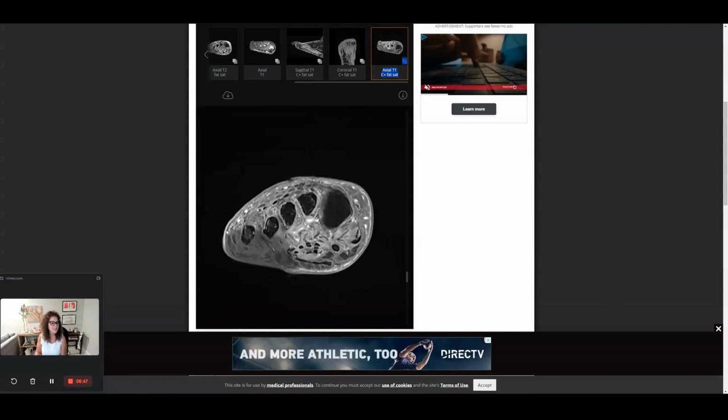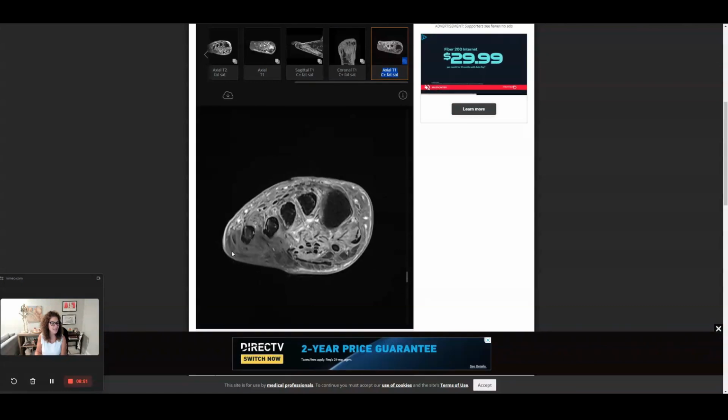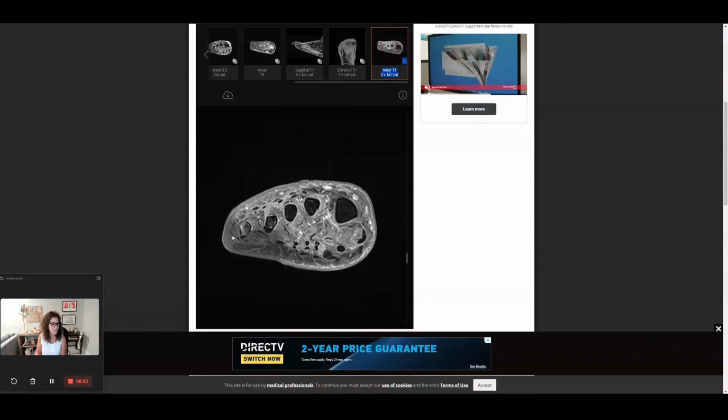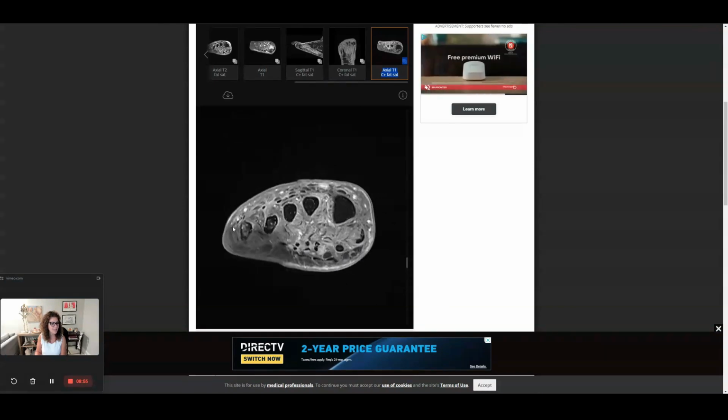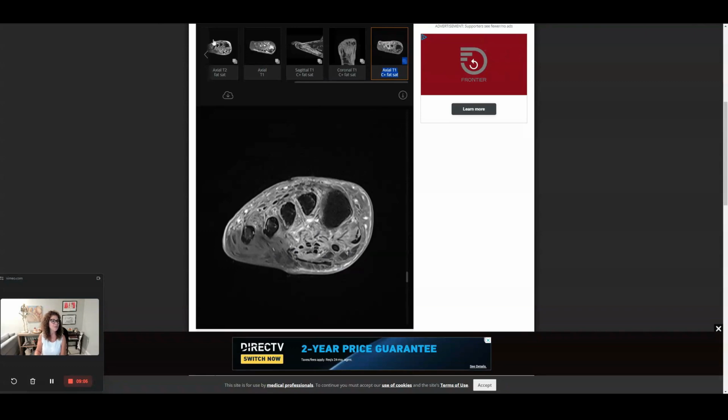Notice that the cellulitis of the positive enhancement in this location and necrotic tissue in this location lower down, and that dividing line between the enhancing pattern of cellulitis and inflammation with cellulitis and the non-enhancing necrotic tissue. So that's a very interesting case.